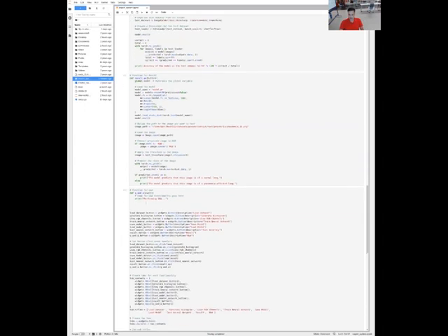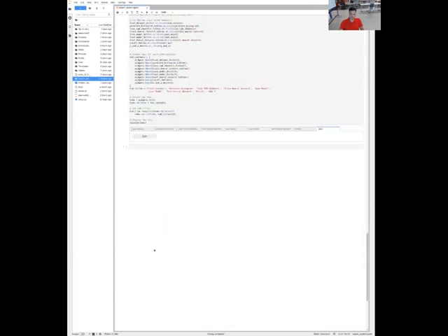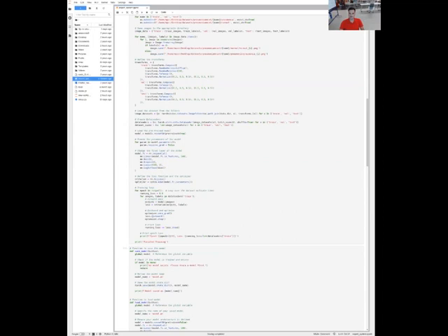And finally, we have the question and answers tab here, where we can start with the questions and answers. Once you get the result, either pneumonia negative or positive, if you have pneumonia negative, then what other steps should you follow? You can ask the questions and get the answers from the expert system. We are integrating here the API of ChatGPT, so that you can ask the questions and get the answers from the expertise of ChatGPT. Well, we can run this code and see how this works.